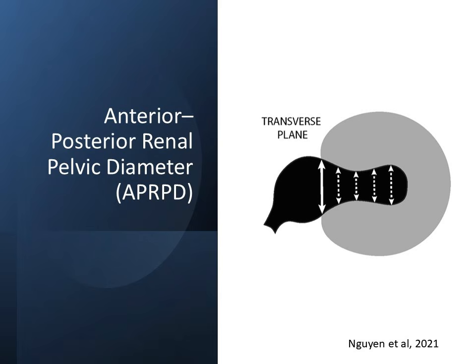Illustration demonstrates acceptable intrarenal locations for measuring anteroposterior renal pelvis diameter. The largest APRPD should be used for urinary tract dilation classification, and in this example, the largest measurement is indicated with a solid line, which happens to be located at the junction of the intrarenal and extrarenal pelvis.